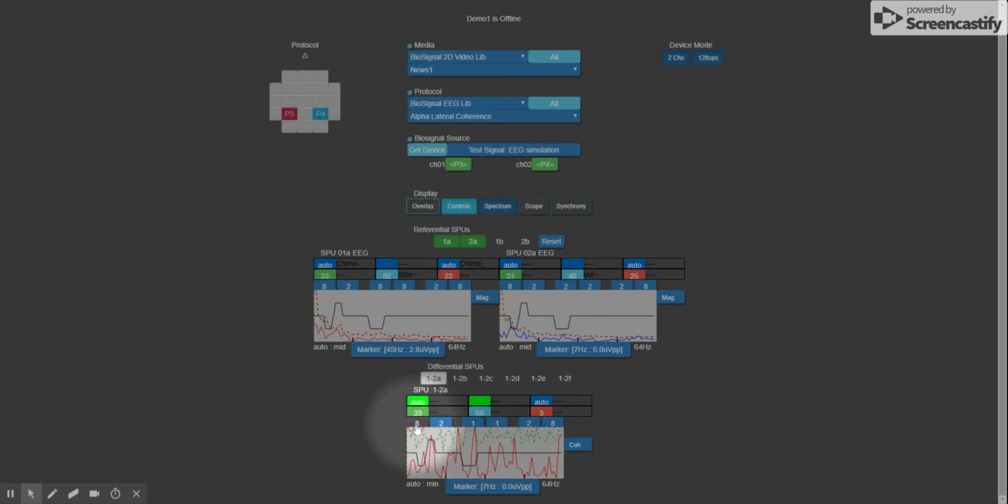Let's change this one. And let's make this one really short by cycling it through 32 and back down to, let's say, 1 second. And let's do a reset on the thresholding and let it grow. We'll see that because that's a fast time constant of 1 second, the red is growing, the red threshold level is growing, as is the reward threshold.